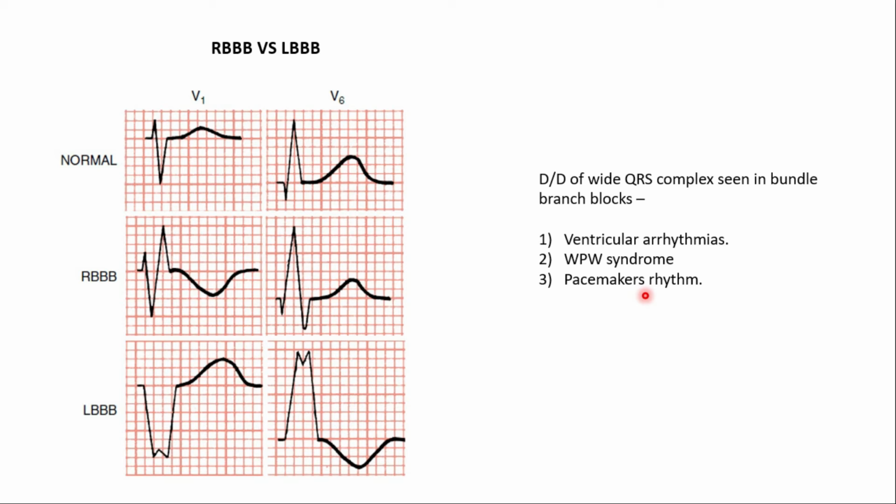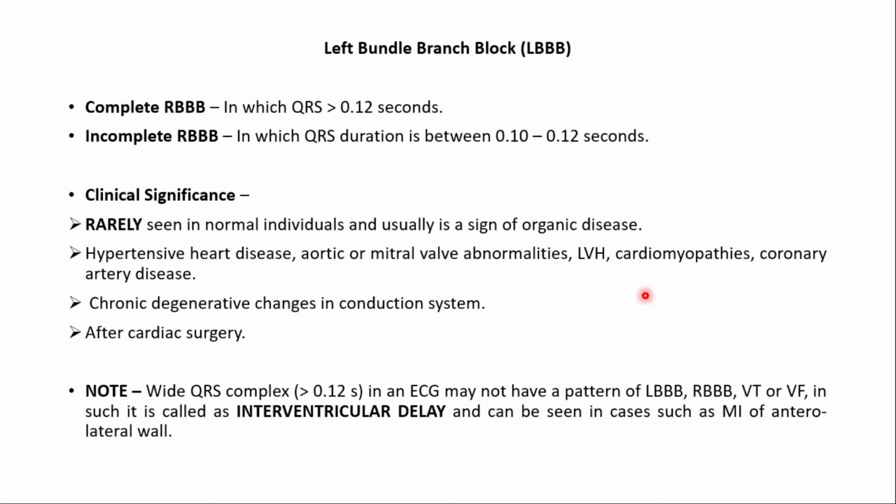In such cases we can think of other organic disease like myocardial infarction of the anterolateral wall of the heart. Okay, and this pattern is referred to as interventricular delay.